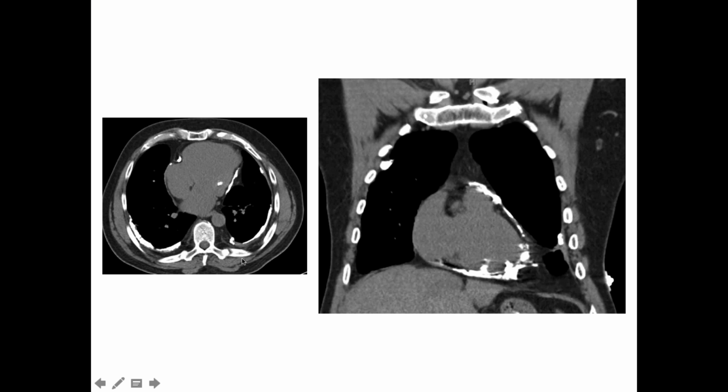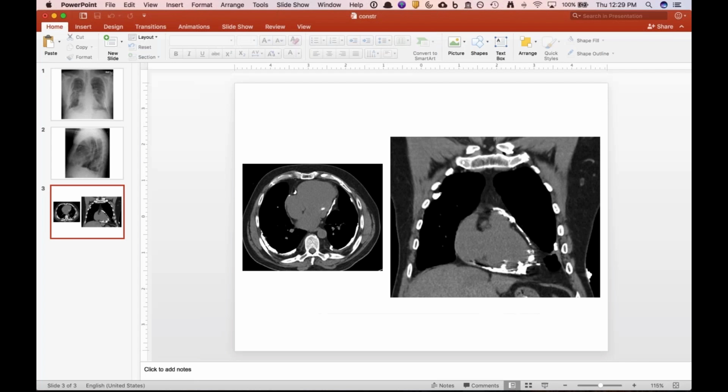Yeah, honestly, I would think that the pericardial stuff is from other inflammation, TB, something else. It may be, I don't know. I've just never seen a case of proven pericardial plaque. It also seems to be sparing the apex, which is characteristic of pericardial calcification from inflammatory things. You know, the apex of the LV is spared, and you've got that little deposit, I think, in the right AV groove there too. That's characteristic of the usual pericardial inflammatory calcification.